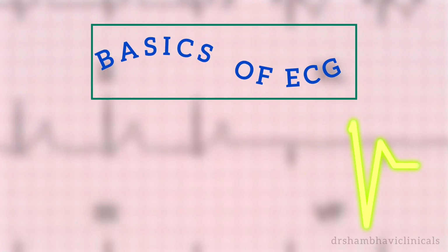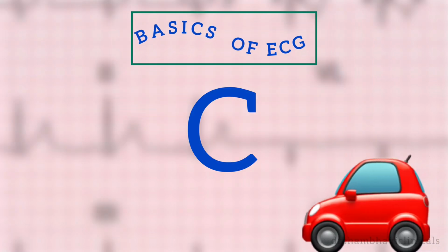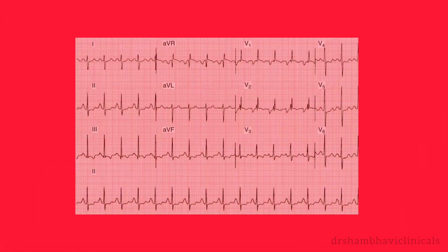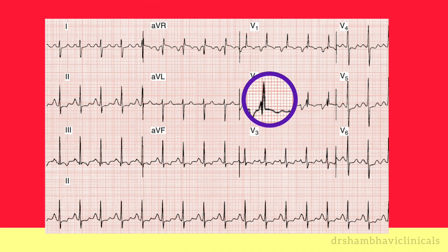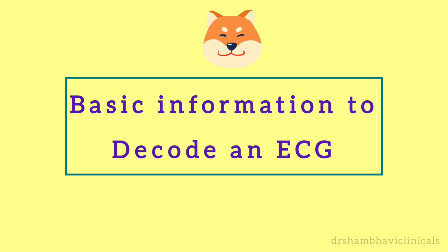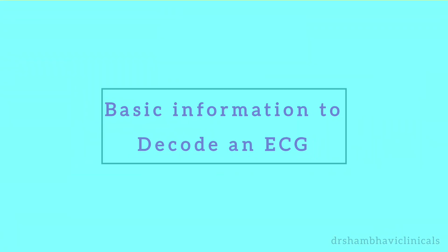In this video, I'm going to tell you the ABC of ECG, or shall I say the PQRS and T of ECG? Now, if you think you already know this, can you try to name this waveform? In the next few minutes, I'm going to tell you the very basics of ECG and its nomenclature.